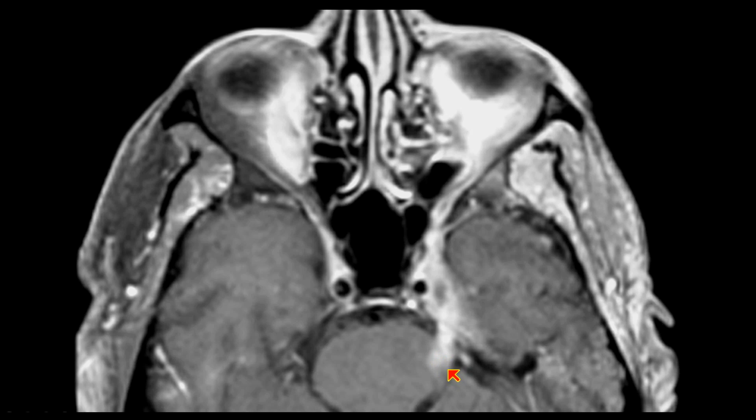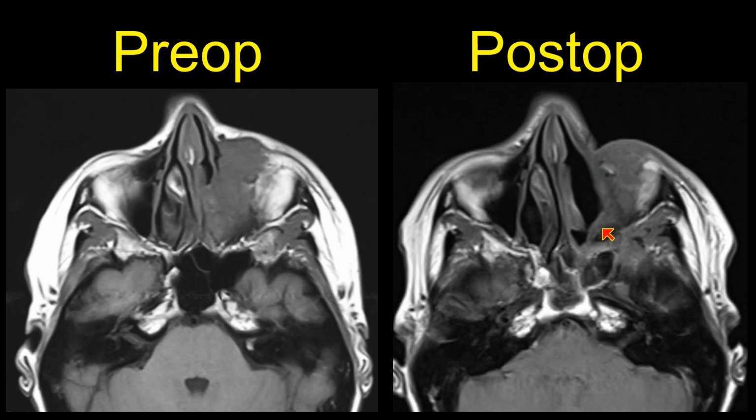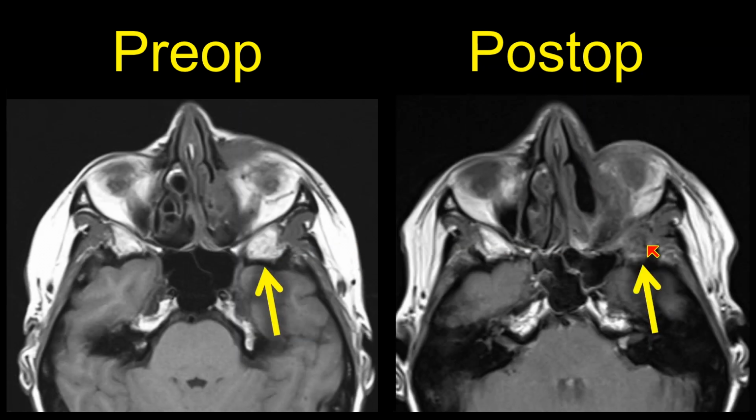But we want to remember that it's not only perineural tumor spread, there's perifascial spread, there's perimuscular spread, there's perivenular spread, and there's even transosseous spread. This is a very unusual case where we had a patient with a rare spindle cell squamous cell carcinoma of the sinuses, and this tumor initially got resected, but what we didn't notice initially on the postoperative imaging, there was actually replacement of the normal fat in the marrow. And as we followed up this case over and over again, there was replacement of the normal marrow fat.